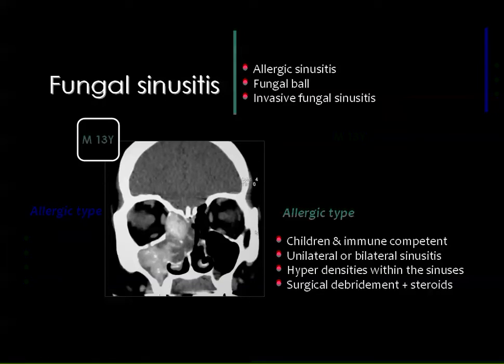And one of the basics for the diagnosis of fungal sinusitis is the detection of hyperdensities inside the opaque sinuses. And these hyperdensities are seen even without injection of contrast media. And this is one of the diagnostic criteria for the presence of fungus inside the sinuses.